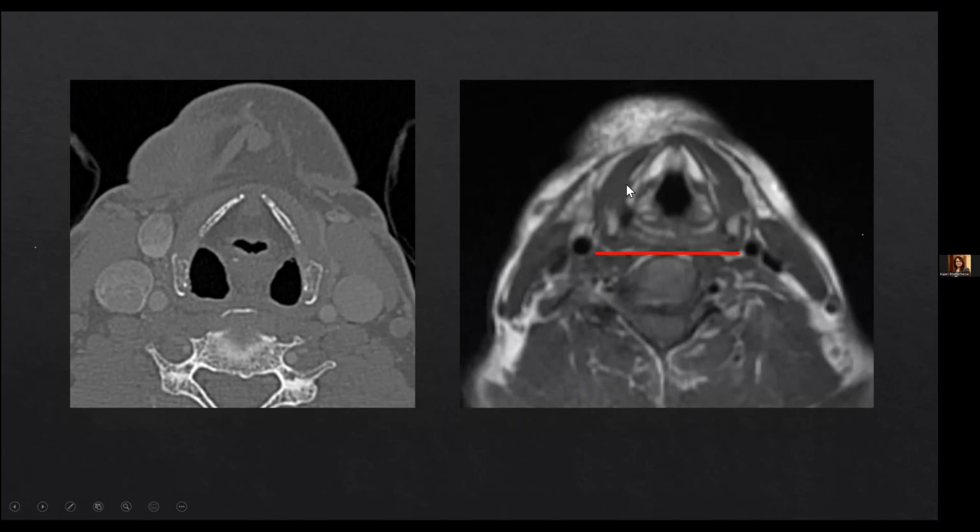So this part, which looks like soft tissue, is the non-ossified part of the cartilage, which will look like the muscle. Again, if you're looking at the ossified part of the cartilage, which looks like a bone, bone has a thin black cortex outside and a medulla, which looks bright. The medulla contains fat, so this appears bright. The cortex appears black. So this is the ossified part of the cartilage, which looks like a bone. This is the ossified part of the cartilage, which also shows similar signals: thin black cortex outside, the medulla appears bright because of fat.